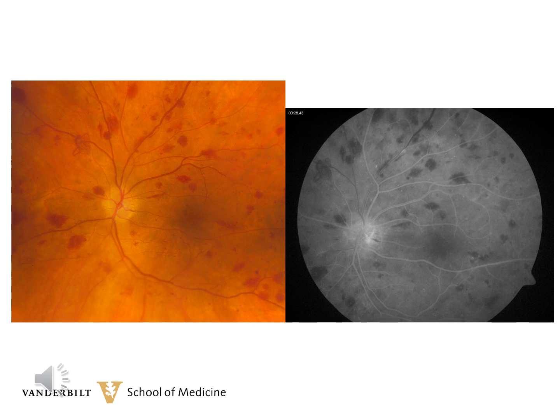This patient has diabetes with severe retinopathy. The most prominent finding are the severe intraretinal hemorrhages, which block the normal fluorescence. But if you look closely, you can see a vascular loop and neovascularization along the supranasal arcade, so this patient also has some early proliferative diabetic retinopathy.